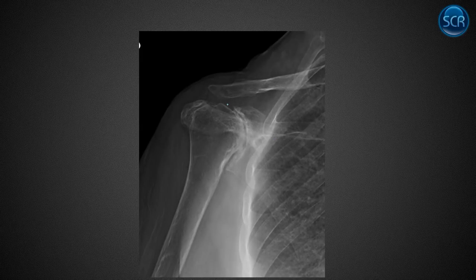And, left untreated long enough, that's going to look like this. Again, we have uniform loss of joint space, proximal migration, and tapering of the distal clavicle. So this is really extensive, long-standing inflammatory joint disease. They're severely osteoporotic. This cortex is paper thin.